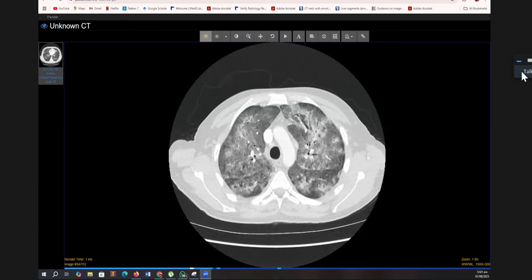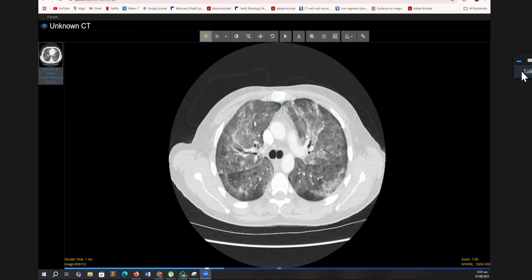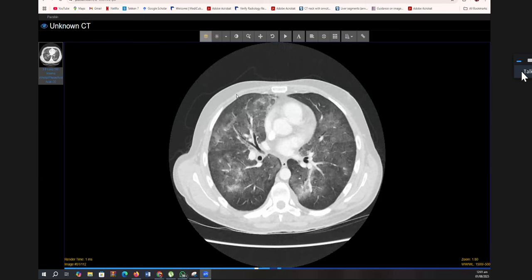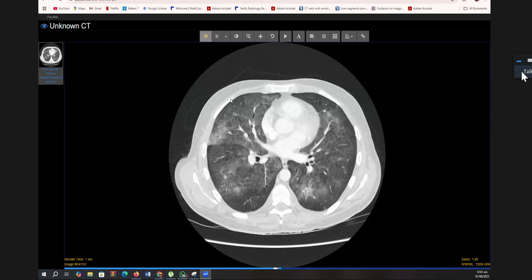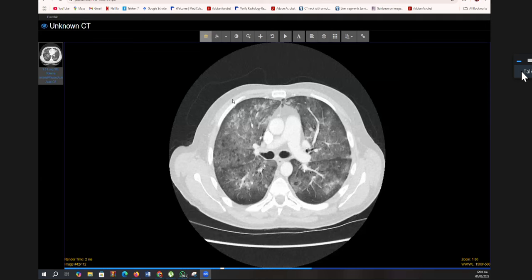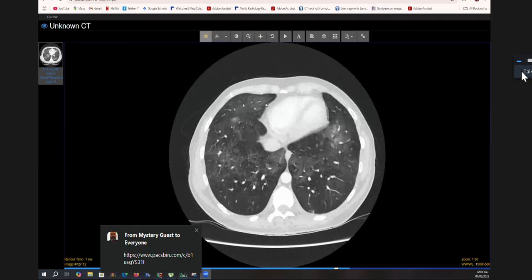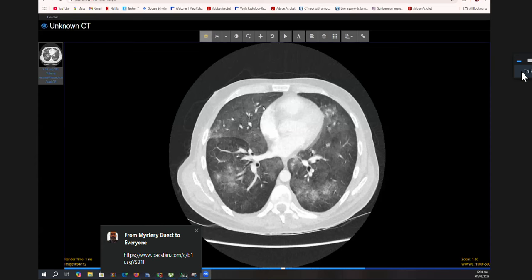Is it loading? Yes, sir. Okay. So it, peripheral sparing, and yes, sir, it was PJP, PCP. Okay. So you saw some sclerotic bone lesions earlier on. Yes, sir.